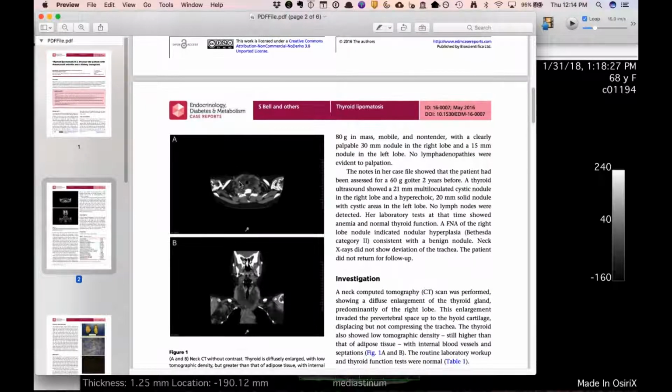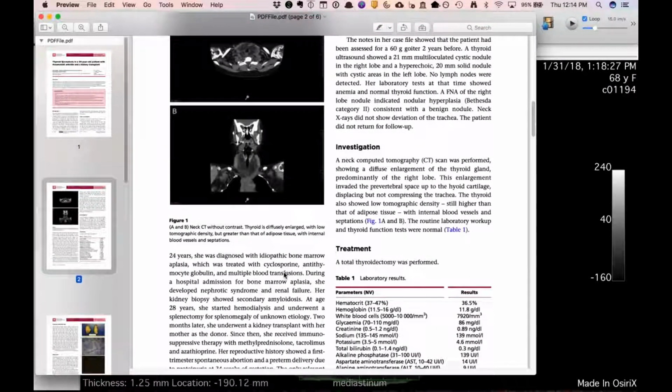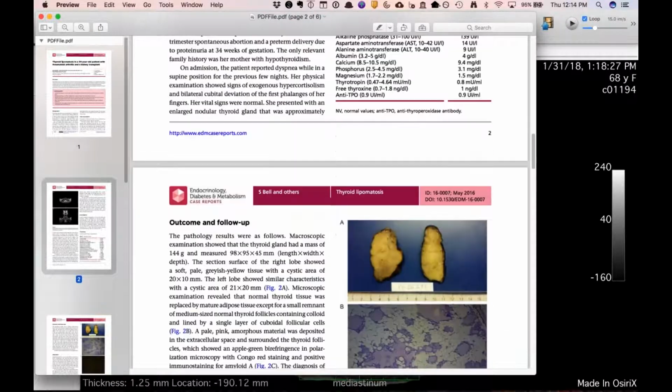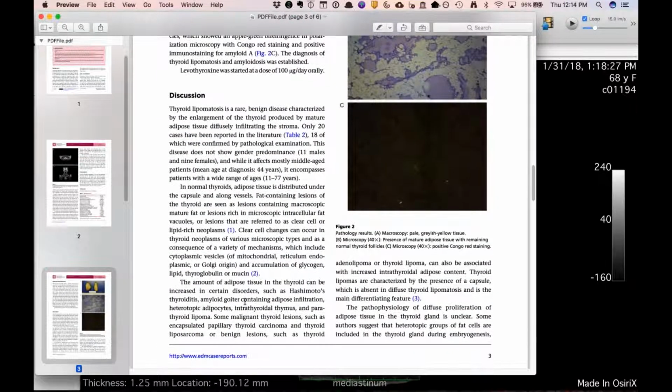I mean, they could have cropped the image perhaps a little bit more. But I'm curious if you guys have seen this type of case before. No, definitely not. I think I would have remembered that. That's pretty strange. Yeah, no, right.